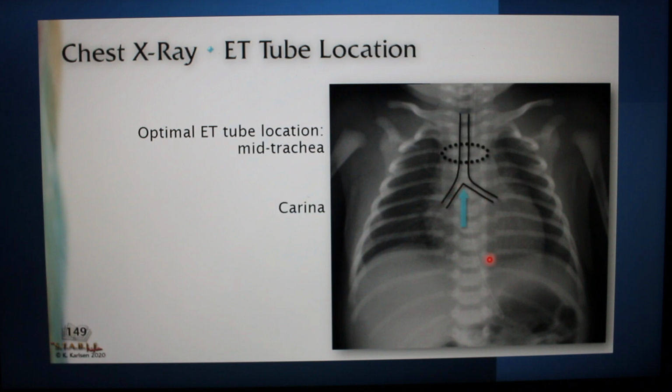So one thing that we didn't point out before is that the vertebral bodies here in the very center are divided into groupings. Above where the first rib comes off are the cervical bodies. They're in the neck. The first rib is attached to thoracic vertebral body 1. Each rib, there's 12 ribs, so we have 12 thoracic vertebral bodies.